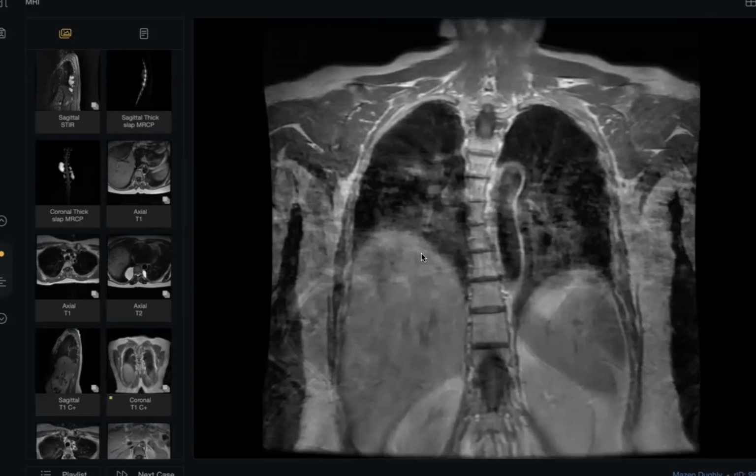I would like to go for the MRI of the brain, looking for absence or hypogenesis of the lateral wing of the sphenoid and brain tumors. Any MRI of the brain, please? I think we didn't have. Thank you, doctor, so much.